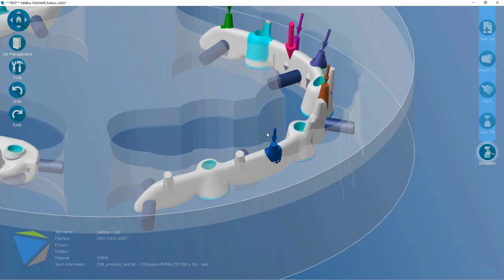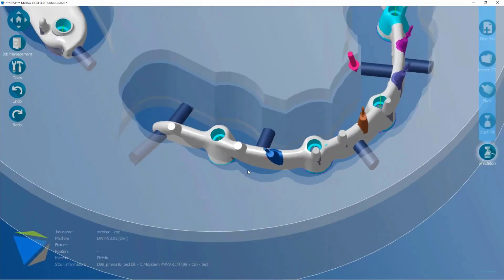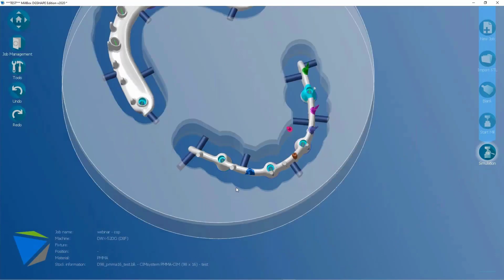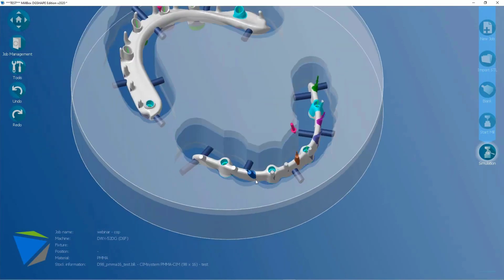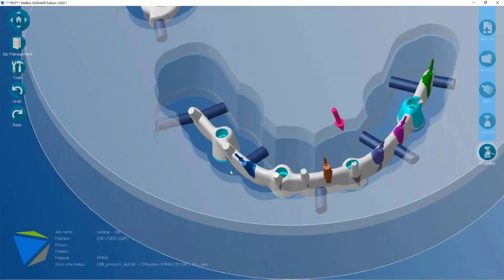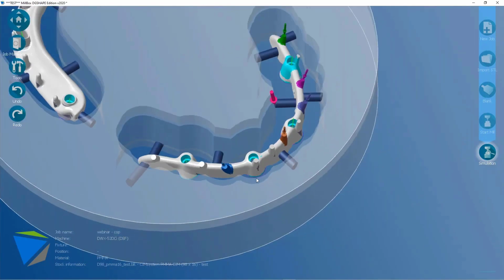And in this way, you can save a lot of time. Why save? Because you no longer have to spend time to remake it, maybe coming back, calling maybe the support, asking, oh, okay, how can I mill it? No, in this way, it's very easy to apply many desired extra operations for that.